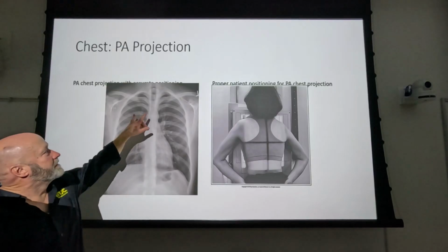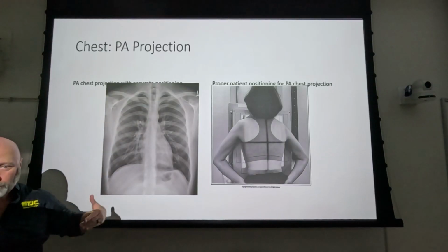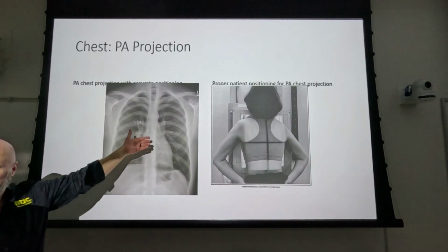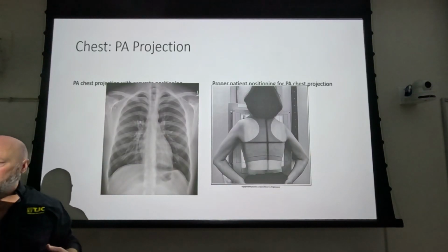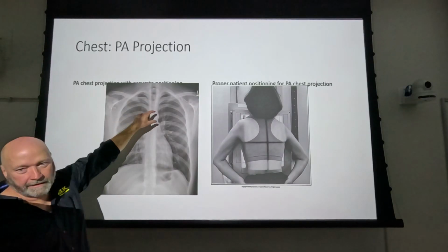Okay. So where the clavicles look like they're intersecting the spine is going to determine lordosis versus kyphosis. If we do a lordotic chest x-ray, where do the clavicles go? Up, right. So if your image presents lordotic, that means maybe the patient was laying back, you were doing an AP, you angled to the sternum, and the clavicles are too high, right? If you have a kyphotic patient, that's going to dip the clavicles lower and closer to the aortic arch.